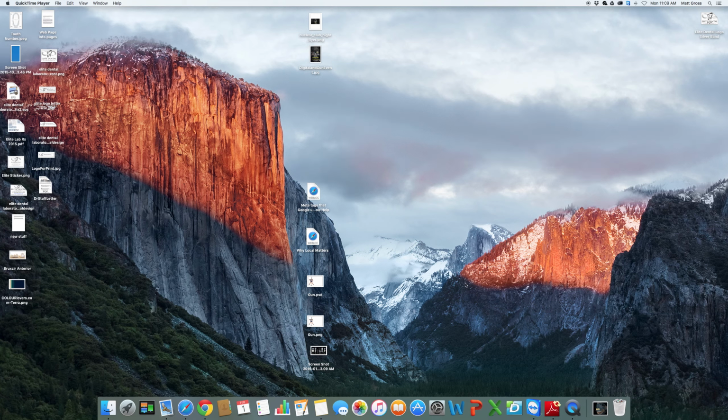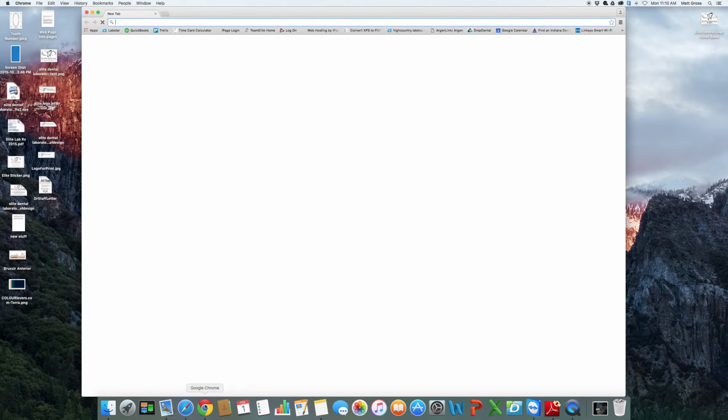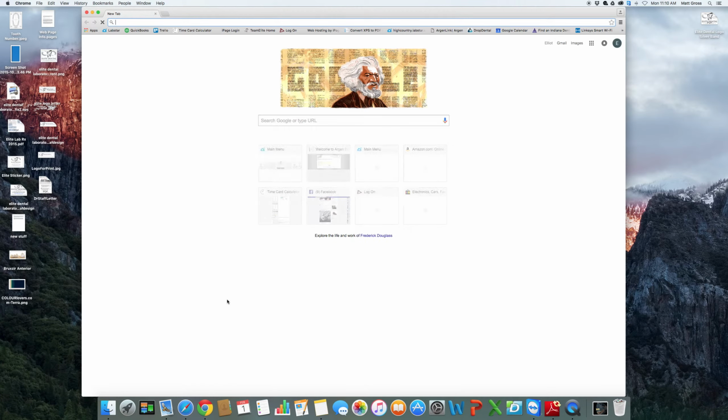To look at the Doctor Portal on Elite Labstar and see how to enter a case. We start by opening Google Chrome, which is the preferred browser for Labstar.